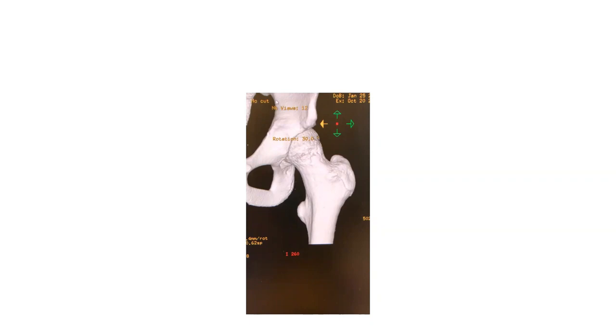And you really want to try to describe what angulation looks like. All right. This one, if we were to describe it, this is shortened, it's angulated, it's also translated. Okay. How much is it translated? 100%, greater than 100%. Is this one translated? No, it's angulated. Is it a complete fracture? No, it's an incomplete fracture. So yet another way to describe this.